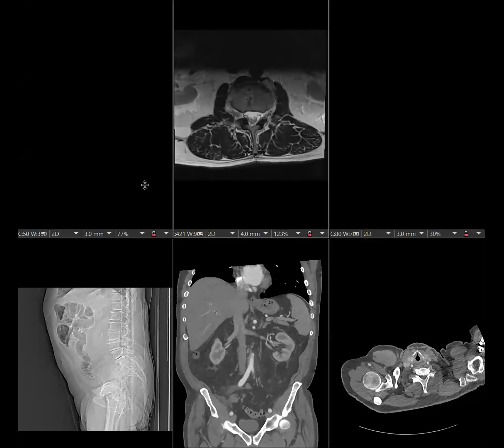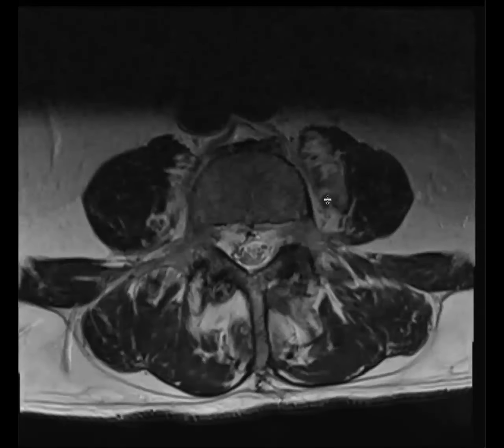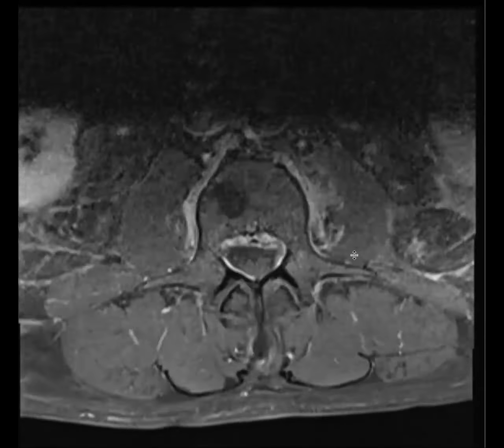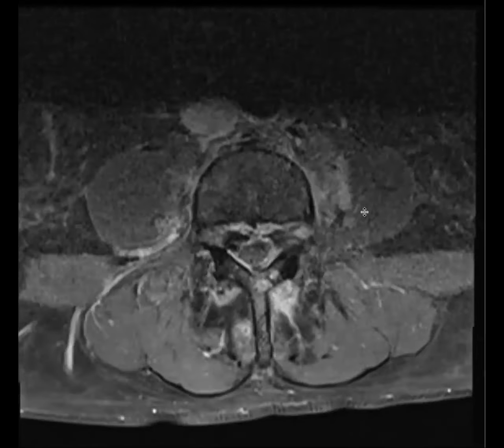This patient was a horse handler and came in with signs of infection. The patient had pain in the back and so on. I got a lumbar MR, which showed edema in the left iliopsoas muscle. Let me give you the fat set right there. No evidence of osteomyelitis or discitis, but lots of inflammation and stranding there, presumed to be infected.